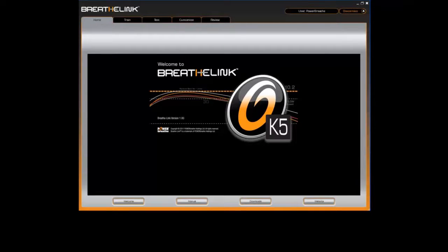Hello and welcome to this Breathe Link video tutorial, a step-by-step guide on how to perform a strength index test using the Breathe Link software. From the home page, navigate to the test screen by clicking on the Test tab.